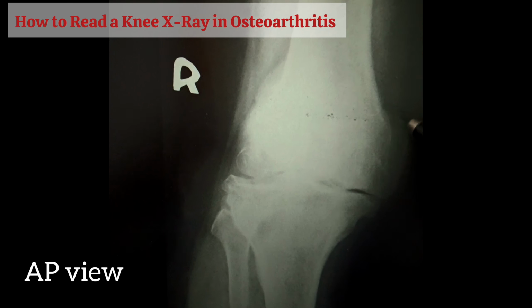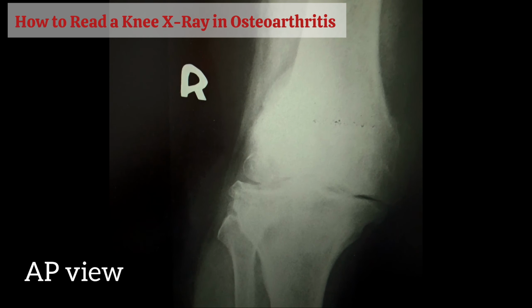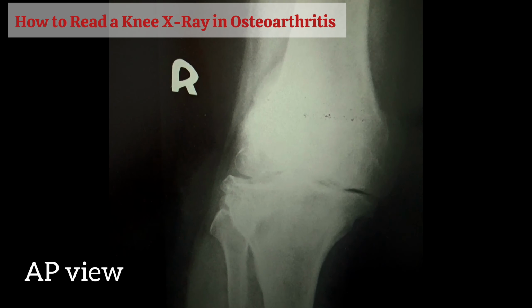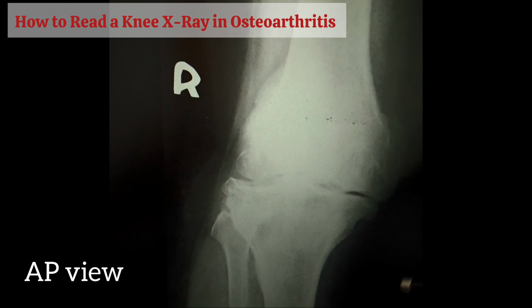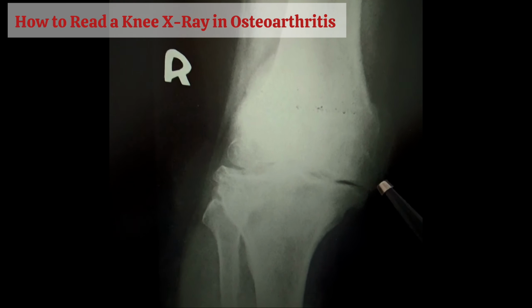Okay. Patients with this level of degeneration usually present with chronic pain, stiffness, reduced range of motion, and may require surgical intervention like total knee replacement. Okay, this is how you can identify or interpret the severe arthritic changes in an X-ray, using the key radiological features.